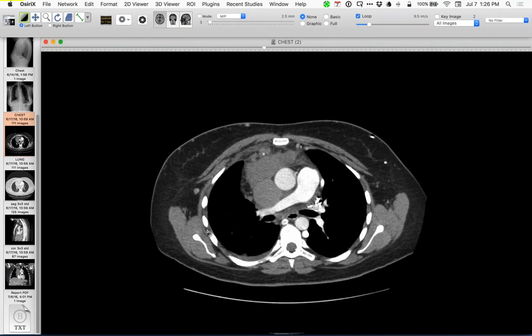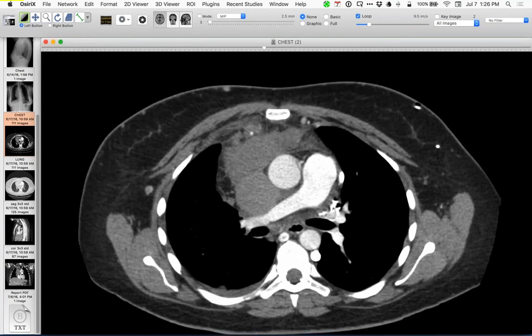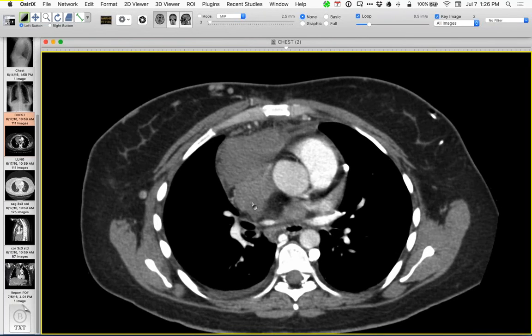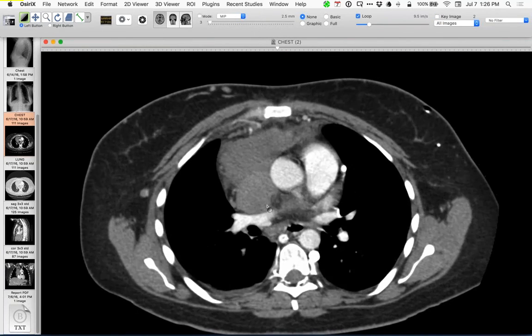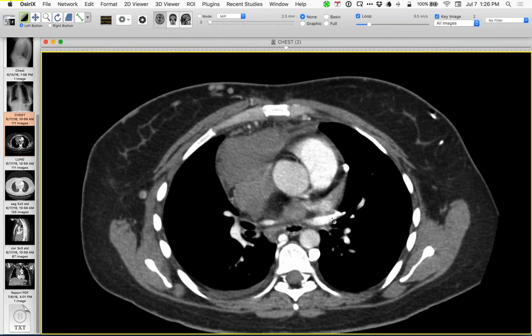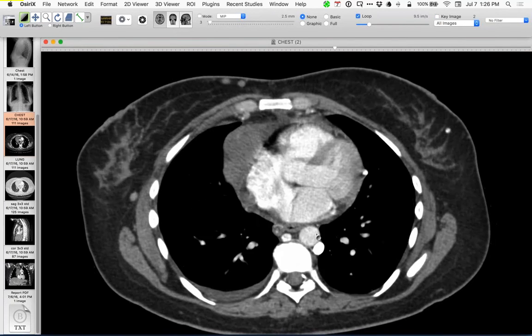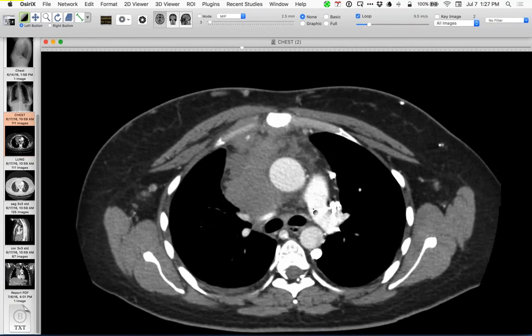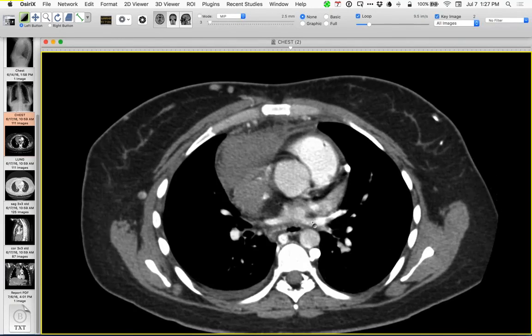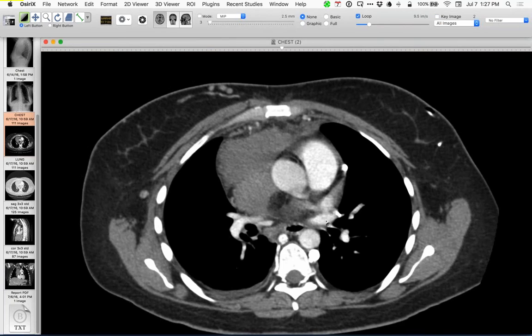Yeah, right there. That image is really nice. Presumably she's young and she's got Hodgkin's, but she definitely has that pathway right there, just by random chance. So a really nice teaching case from several points of view, both for the mediastinum, Hodgkin's, as well as collateral pathways, and then that little right to left shunt that we sometimes see.